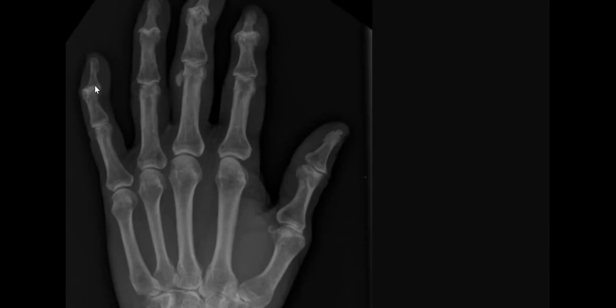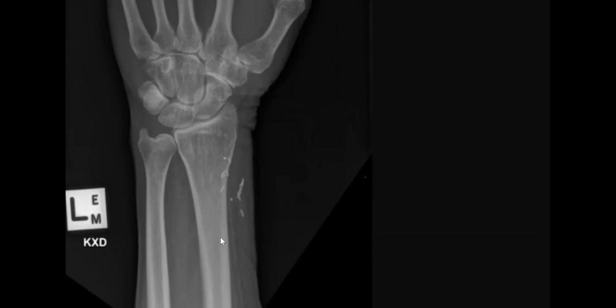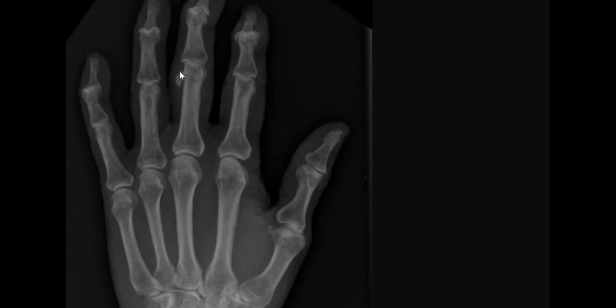Okay, maybe some erosive osteoarthritis. The patient may be 40, for example, not 25. But soft tissue calcification, early vascular calcification, and surgical clips at exactly this location. So fistula formation, maybe. Yes, hemodialysis fistula. Yes, surgical clips, likely. Secondary hyperparathyroidism, vascular calcification, soft tissue calcification.